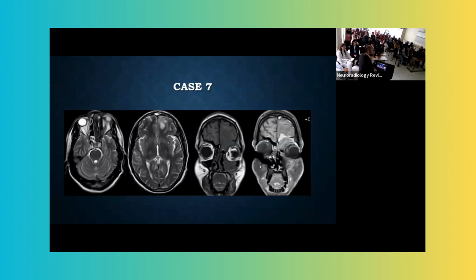So what it's causing is it's breaking the bone, and it's coming into the brain parenchyma, causing focal cerebritis. All of this is called the cerebritis, okay? And there is a focal enhancement, and then this is leading to abscess formation. So this is the spectrum of the start of the disease, from outside to the inside, from the meninges to the cerebritis, to formation of encephalitis, and then the abscess formation, okay?